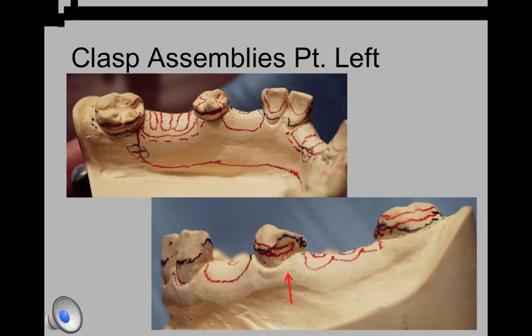This separates retention as much as possible and places the direct retainer tips posterior to the posterior fulcrum line and anterior to the anterior fulcrum line. One problem of going from the mesial to the distal, as on 29, with the retentive arm, is that a lot of metal shows, because you would see it from the facial when you're looking in the patient's mouth. We do not use this on maxillary premolars because of aesthetics.